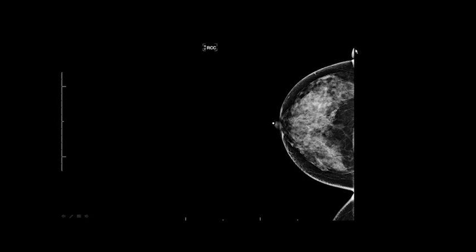But look over here laterally. Just a tiny bit of the shoulder. Just a tiny bit. This would be a good dense breast to send in, if they, of course, could have got the shoulder out a little bit more. So if your techs see this, it's a good accreditation image. Send it in? Go back and repeat the image.